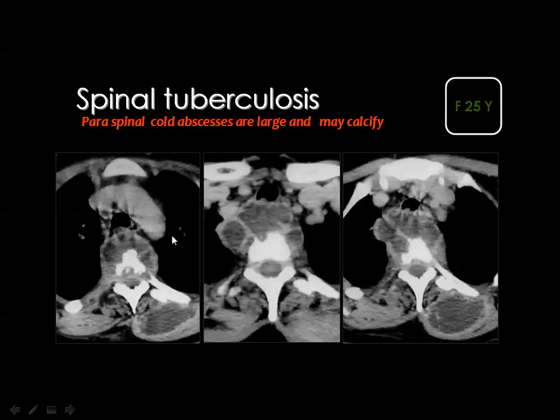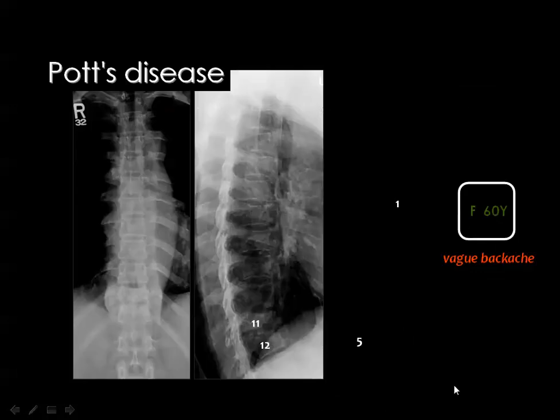And here you see infiltration of the vertebral body, its erosive changes, prevertebral multilocular abscess, and also abscesses in the back muscles. As I have said, we used to think of tuberculous etiology whenever we see these abscesses affecting the muscles, but nowadays the two possibilities are there: pyogenic and tuberculous infection.